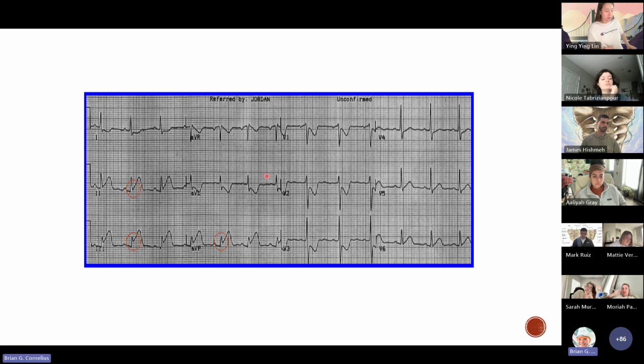When you look here, it's pretty easy to make out that we're starting to have ST elevation. One thing for us to figure out is where our isoelectric line is, because that's really what we're elevating above. So when I look here, here's my isoelectric line. I can generalize that from the complexes I'm looking at. And I can easily see that I've got a little bit of ST elevation in lead 2, far more pronounced in 3, and then again evident in AVF. So I have ST elevation there.